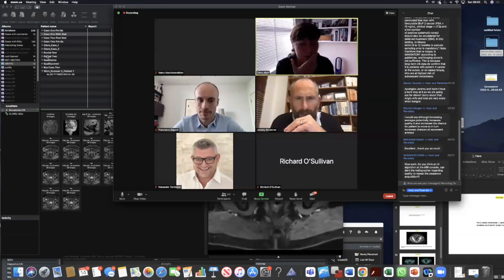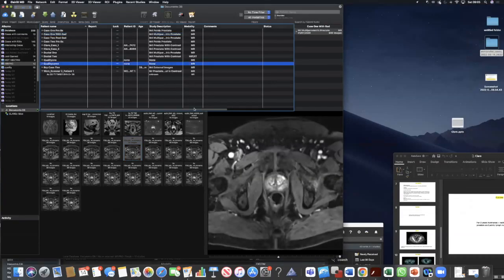Sorry, Claire, have you got a few moments to show at least perhaps examples of these poor studies? I can show maybe just one poor study, because I've got about half an hour again, so we'll take a return trip, Jeremy, if that's okay. Absolutely. All right. I'll just show one bad study maybe, and then maybe one showing the effect of gadolinium on a bad study. So I'm just going to share my screen. Hopefully that will share. So I'm just going to show you one bad study.